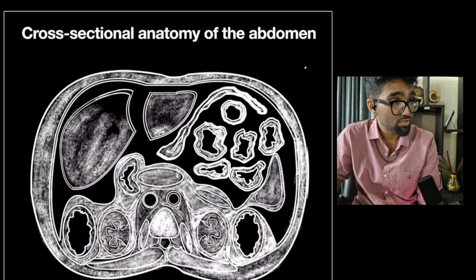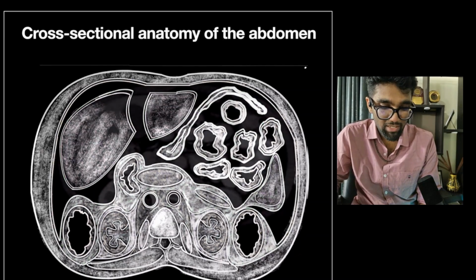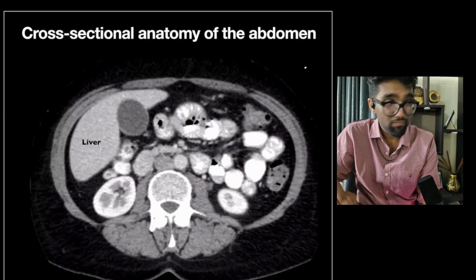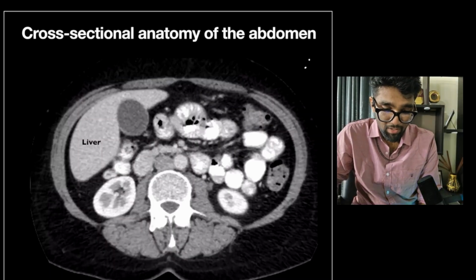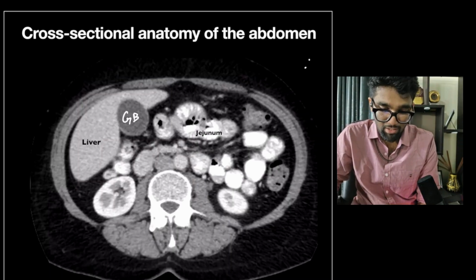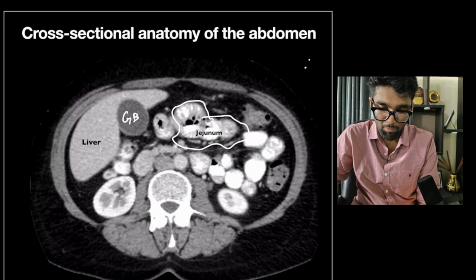This is what you would see in a CT schematically, and then I can replace that with the actual CT image. So now in this actual CT image, you find the liver there on the left side. This is actually the gallbladder. Okay, it's distended. In my diagram, it was not distended. These are the jejunal loops, as I discussed, in the left upper part of the abdomen.